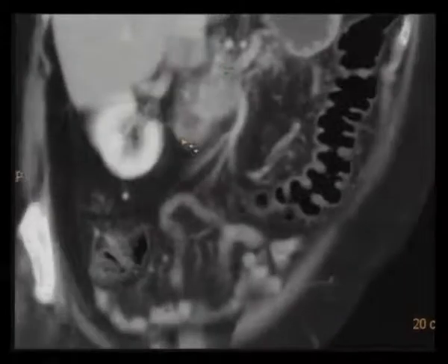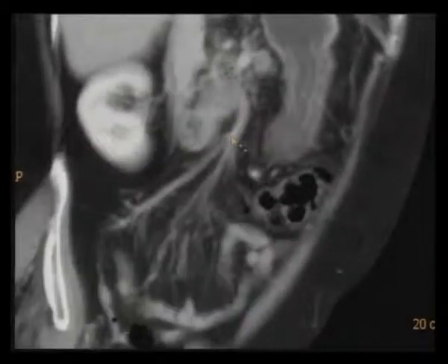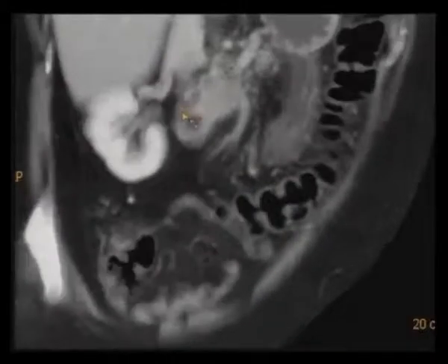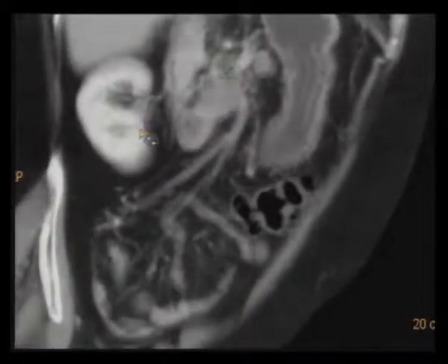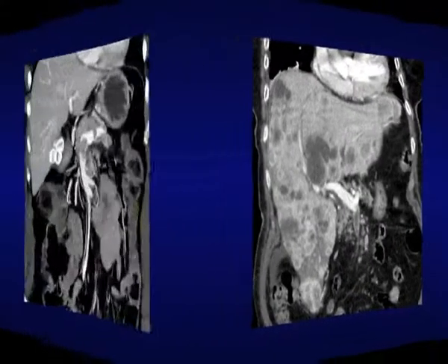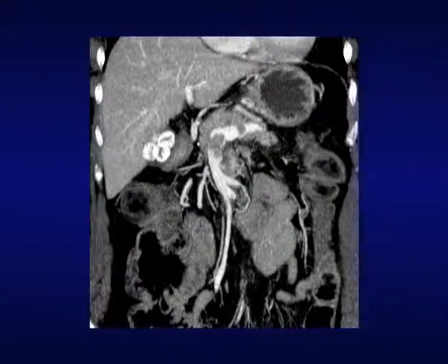This is the superior mesenteric artery, the superior mesenteric vein. We see only an enlarged mesenteric vein and enlarged mesenteric trunks that are a sign of complete involvement of the superior mesenteric vein. So this is grade 4 without any doubt. So we radiologists have no role in cases like this. We can only watch and see such disasters.